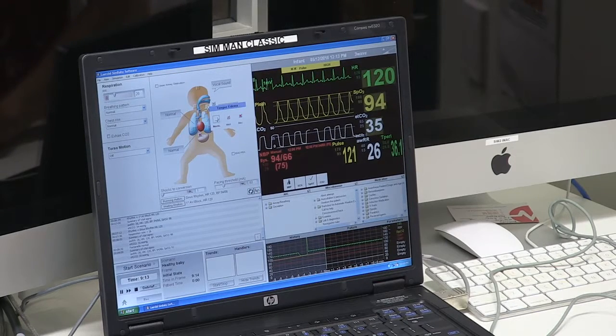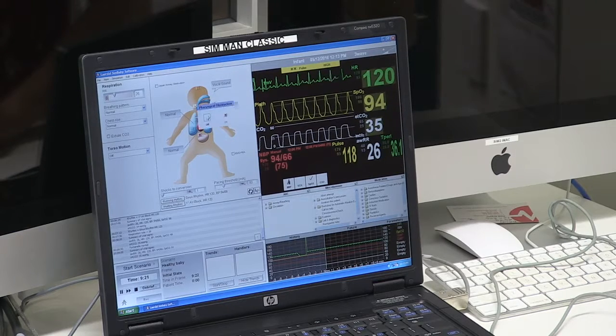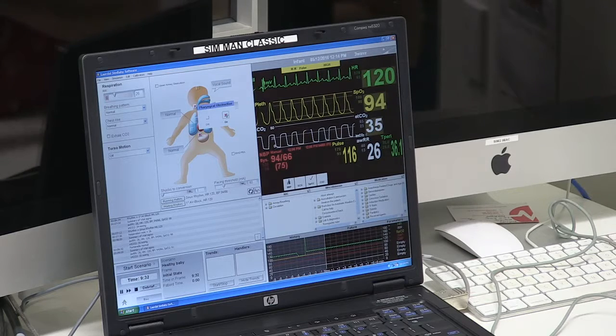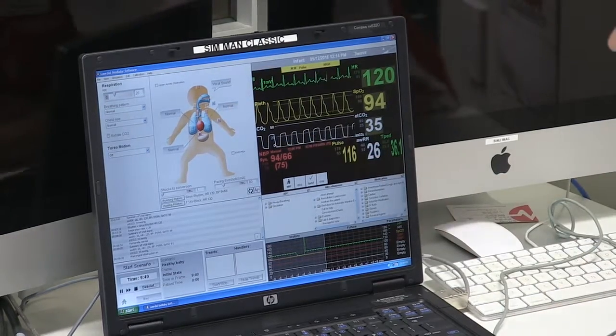You can get tongue edema. So you've got normal, medium, and maximum that you can check on. Again, just hover over it and click on that one. You've got pharyngeal obstruction on or off. You can either click it here, or if you know what it is already, you can just click it there and you don't have to hover over it. So it's pretty user-friendly and pretty quick. It just takes a little bit of practice to know what you're looking for, because all the boxes are kind of in a small area.